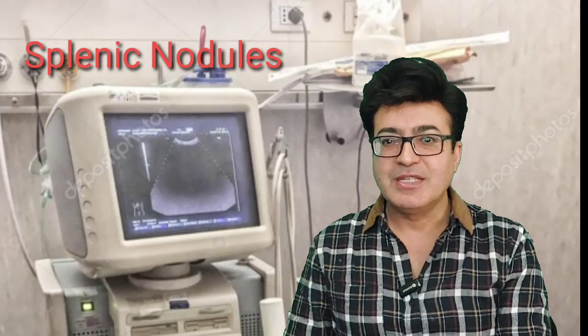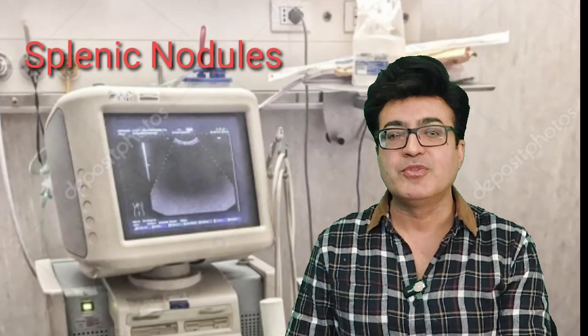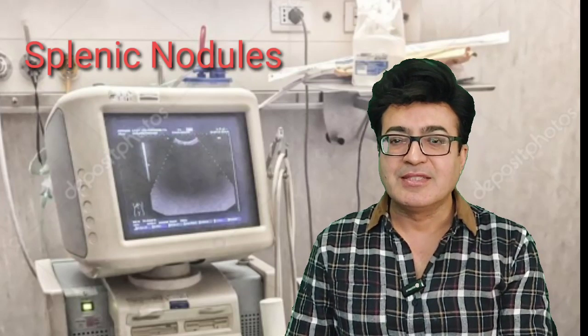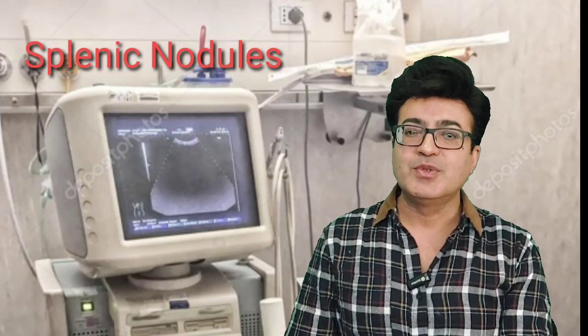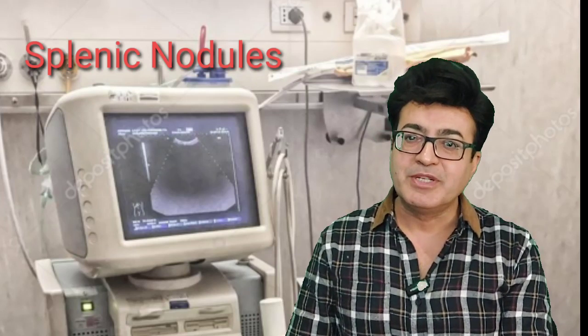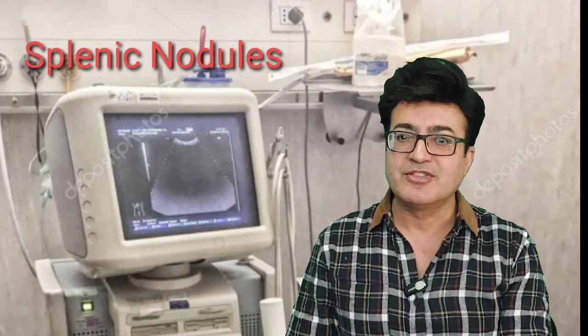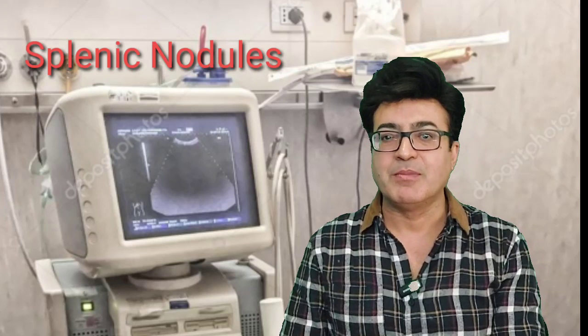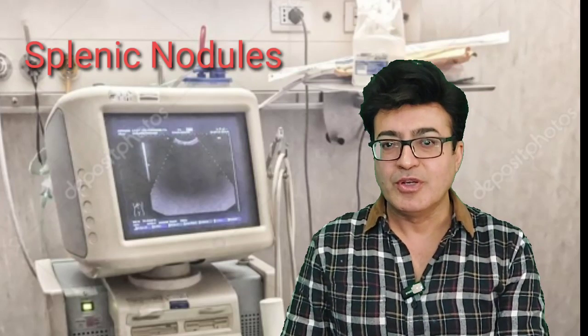Micronodules may be sub-centimeter, and can be seen especially in tuberculosis, in one particular form of tuberculosis which is called miliary tuberculosis. Besides this, you can also observe micronodularity in lymphomatous patients, when there are micronodules scattered within the splenic parenchyma. Sometimes metastasis will also appear in micronodular form.